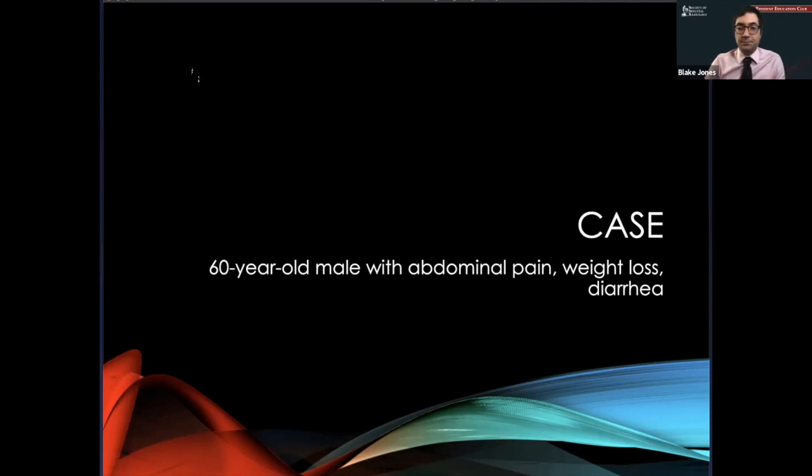Okay, the other thing I wanted to comment on this case is that you have a soft tissue mass, and you pointed out that the perilesional contrast enhancement makes it a little bit more suspicious, but we can have soft tissue sarcomas without any perilesional enhancement. And in fact, when you do have perilesional contrast enhancement, it's most likely to be a high-grade tumor, much more likely to be a high-grade tumor than not. So not having perilesional contrast enhancement doesn't mean it's a benign lesion.